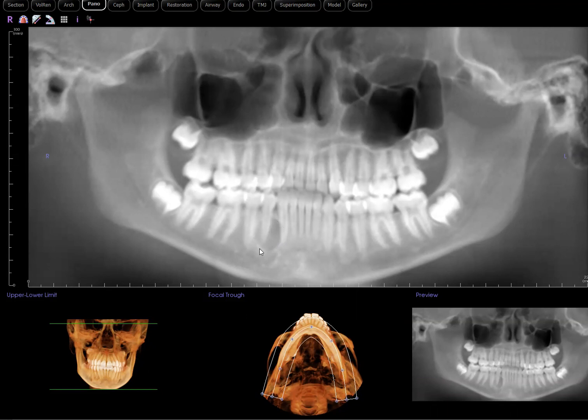Now, like we always do, let's assess its behavior on the surrounding structure and internal density. Well, internally, it's pretty clear that it's radiolucent. We don't see any heterogeneity or mixed density type of appearance. Any root resorption? Not really. Any displacement? That's tough to tell, but I think one can argue that there may be an increased interdental distance between this canine and first premolar, especially when you compare that to the other side, okay?